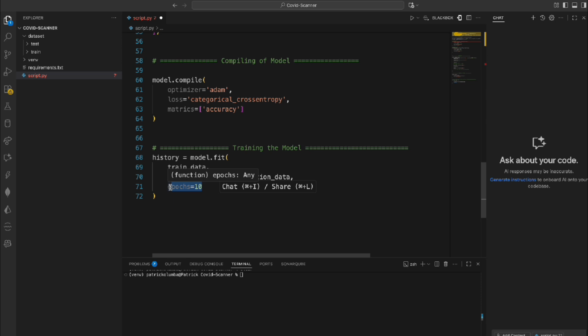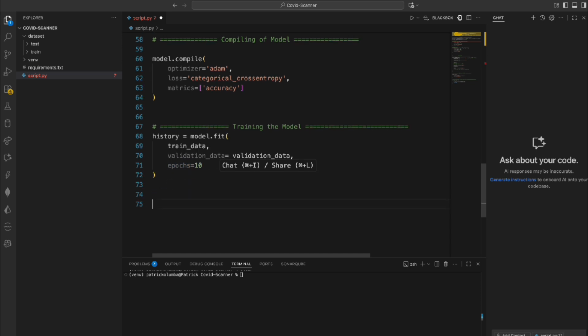So let's move further right now. We just want to do a little plotting. Remember when I told you we have histogram, and we're going to do some plotting right here just to see what's going on. It's good to plot to see what's going on. Sometimes when I train my model, I skip this part, but it's really necessary sometimes to see exactly what is happening and how your model is being trained. So we're going to go ahead right now and visualize our training.